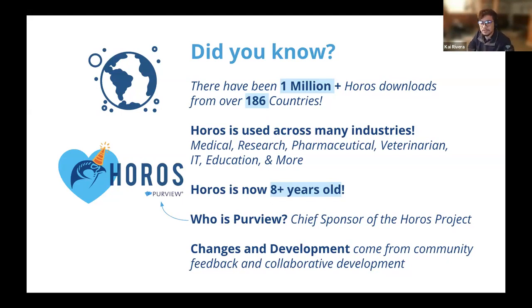Today we're going to be talking about our image solution, which essentially has been a culmination of the changes and development provided by the Horos community. You know, how can we get access to images all across different workstations? How can I do reporting and get those to other places? How can I have a cloud solution to work with Horos? So many users of Horos interact with the program for a couple months, perhaps during their studies or during their research. But for other practices that might need to fulfill a need of sharing access and mobility, the Purview image solution has been there to help for many years.